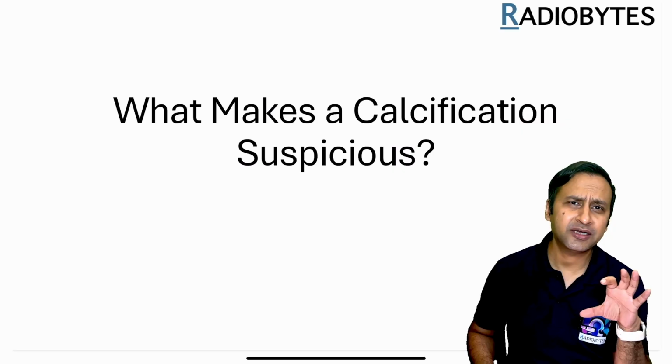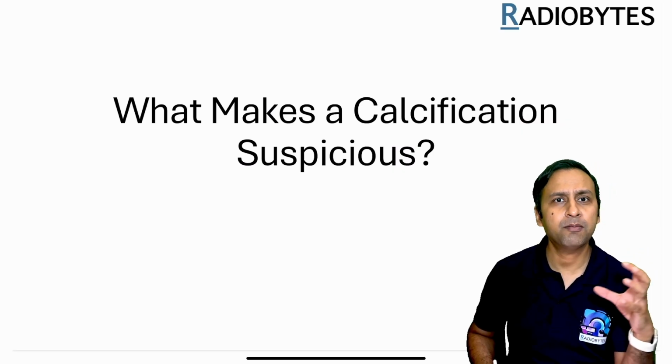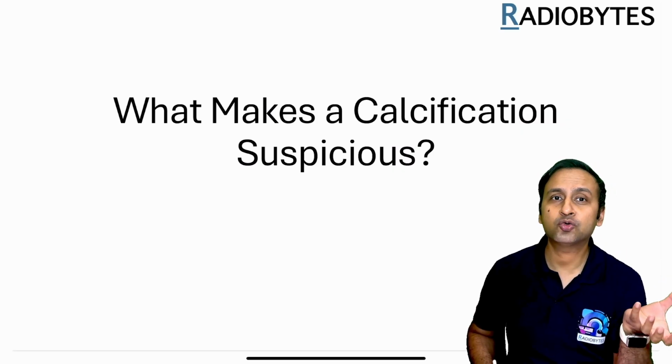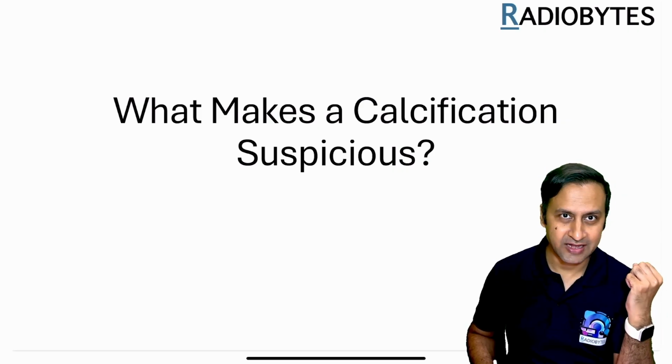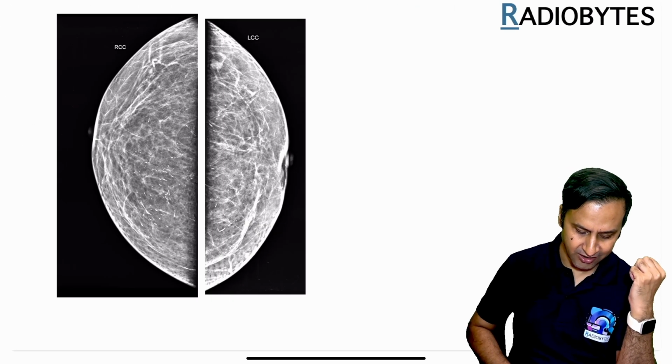Now, this is going to be an interactive session. We're going to have a look at a number of cases, and by looking at those cases, we'll try to identify and come up with the suspicious features for the calcification. So let's have a look at our first image, our first mammogram.